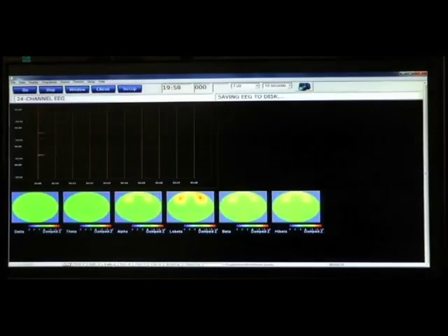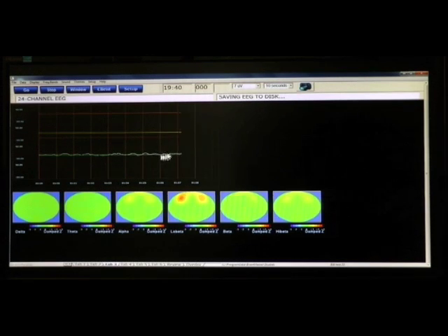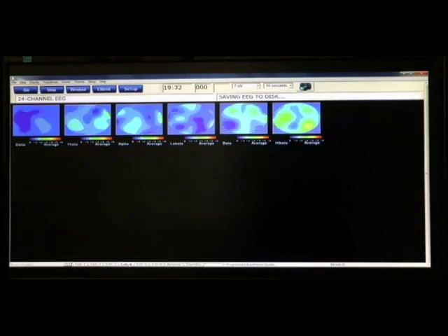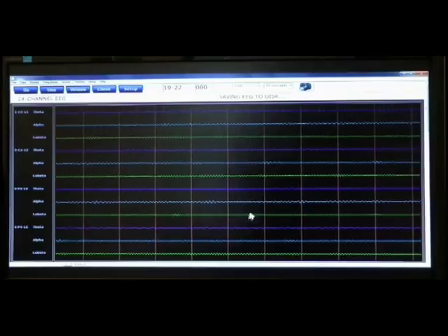Tab 3 shows me my Z-score training window, and this is showing me the threshold, or that C key, that the C key adjusts. The white line represents the number of Z-scores that are falling within the range of plus or minus the specific standard deviation that we set. Okay, and we'll talk a little bit more about that later. These are an example of some flat maps, but I'm just giving you examples of different tabs of what you can have on the display for you.